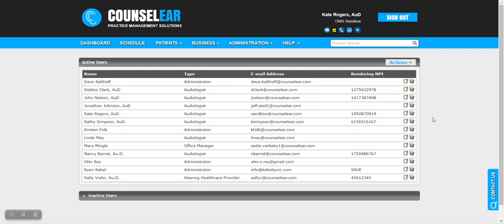Once again, this tool is primarily used for instances where you have concerns that fit dates are being modified inappropriately or unintentionally. If you currently have no concerns about that, then you likely would not need to activate this feature.